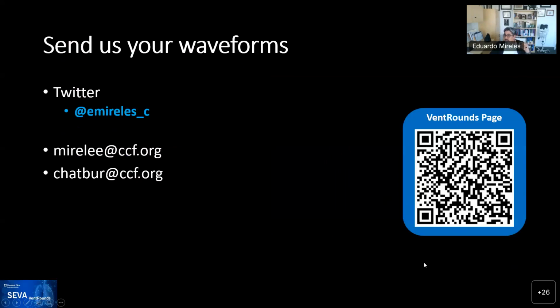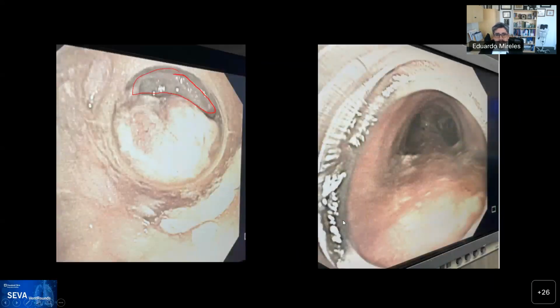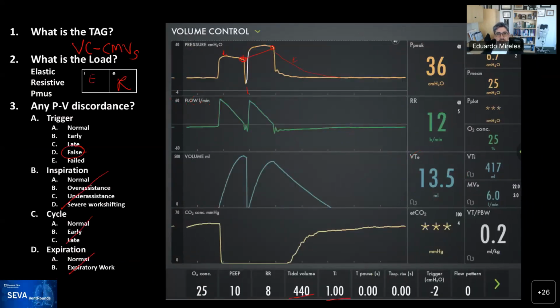Now there's a couple of questions that are coming in. Excellent: how would you differentiate intrathoracic dynamic expiratory resistance from extrathoracic? Well, I voiced a little bit on the differences. If the cause is an expiratory filter, you would expect changes on your pressure waveform. So usually when it's downstream, before the device, you will see that the pressure is taking longer.